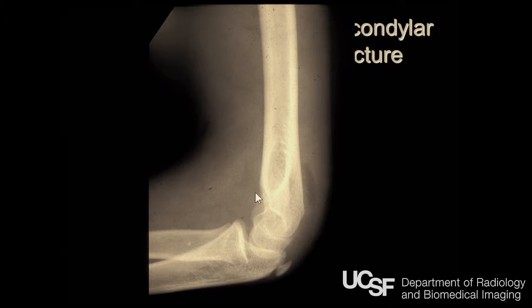You usually see fat here anteriorly in a normal patient, but it's at a very shallow angle with respect to the long axis of the humerus. When it's pushed up, it'll form a sail. It'll come out at like a 40-degree angle instead of like a 15-degree angle relative to the bone. But all you need is one. When you see it, look for what's wrong.